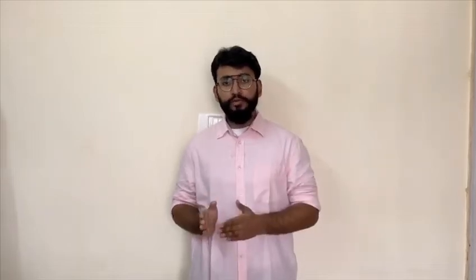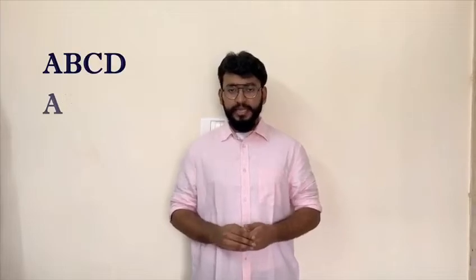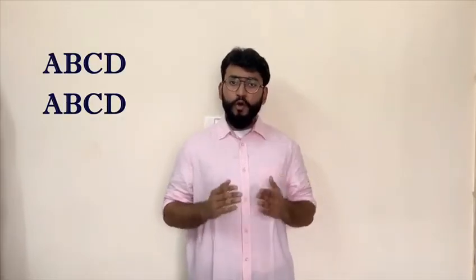To read any x-ray, we have covered 4 basic steps in our previous video. Now you can apply those steps while reading a chest x-ray. However, for the sake of convenience, we have come up with a simple mnemonic for reading a chest x-ray. The mnemonic is ABCD, ABCD. Now before we see in detail what these are, let me just list them for you.